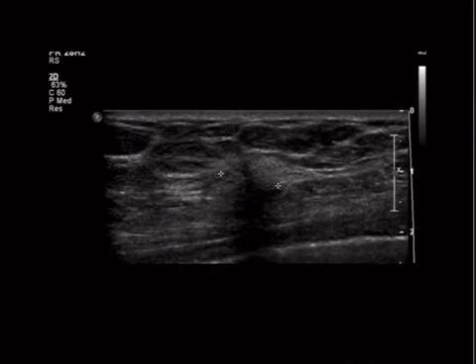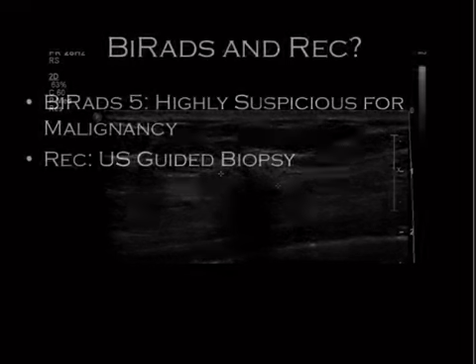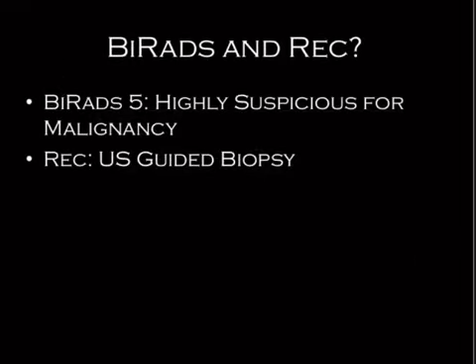Here we go, and we've got our ultrasound, and this is what a breast cancer looks like on ultrasound. It's a shadowing mass, it's irregular, the margin is indistinct, anti-parallel. It's got all the bad things. It's bad. That's a cancer. So we have to BIRADS 5 that based on the ultrasound appearance. Based on the mammographic appearance, it could have been a BIRADS 4, but once you see that it's got every classic feature of a breast cancer on ultrasound, then you have to BR5 it.